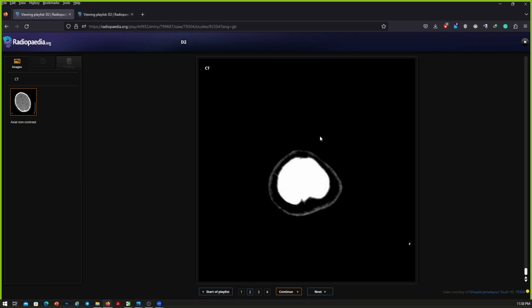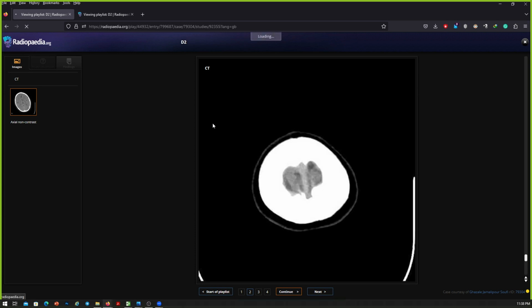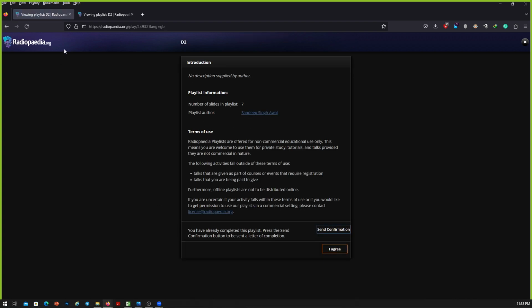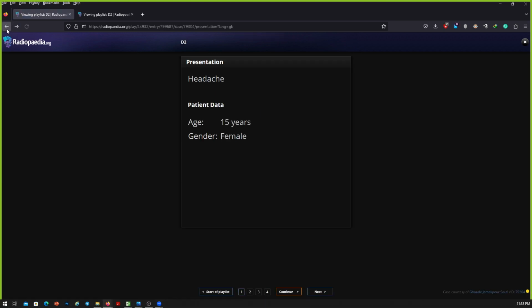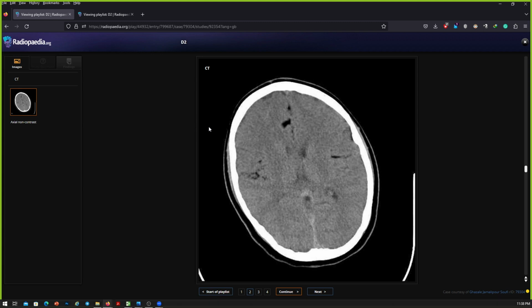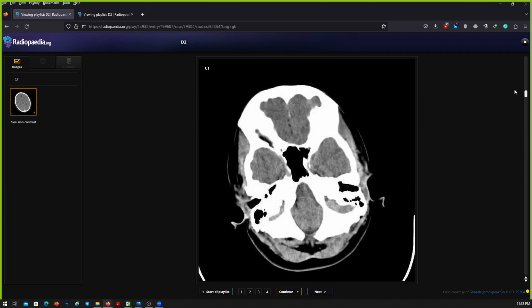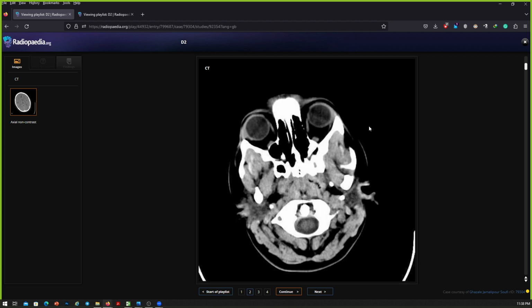Okay, have a look at this case, please. You can scroll if you want. Yeah, you'll have to scroll. So please scroll. Yeah. No, sorry. I used the right and left instead. Okay, I'll do it for you. Never mind. So the history is headache, and you're good to go. You can scroll. Okay, up and down. Yes, it's correct.